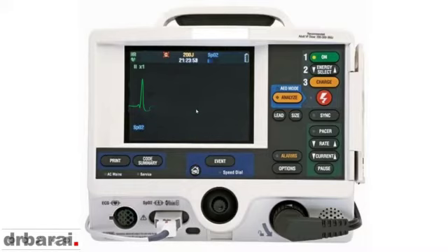This is Wolff-Parkinson-White syndrome or pre-excitation, and they can develop rapid atrioventricular re-entry tachycardia. They can have orthodromic or antidromic conduction, and they can be life-threatening as well. So these patients must be consulted with a cardiologist, and appropriate measures should be taken. So this is Wolff-Parkinson-White syndrome or WPW.